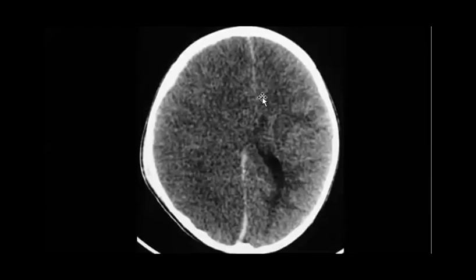When you describe the ventricle, you will describe that there is some compression, or you cannot see it well, right? And the falx here, what happened with the falx? There is some subfalcine herniation. Yeah, some bowing, or you can consider it as herniation.